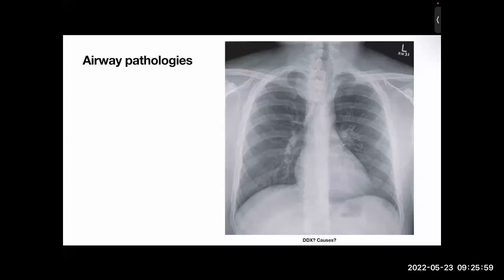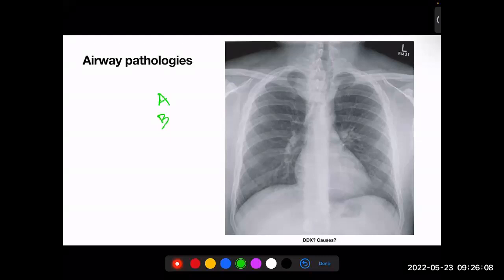Okay, I should not be taking you through this, but let's take you through this. We remember always A, B, C, D, E. So let's start here. This is our trachea. But what is our trachea doing? It's deviated, yeah? So it comes this way, you can see. Then you can see the trachea down there. Okay, fine. That is our trachea. Then we go to the lungs. The costophrenic recesses are normal. The apices up here look normal. No big issues here.